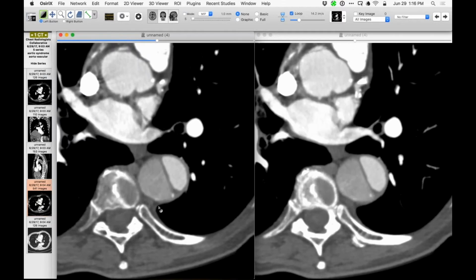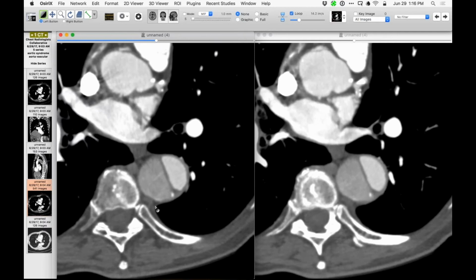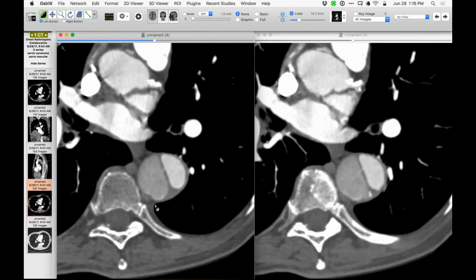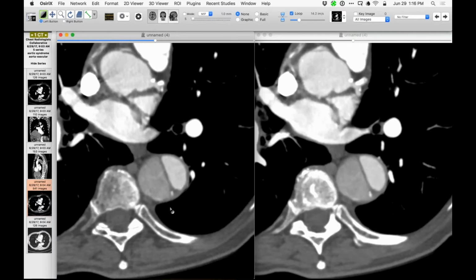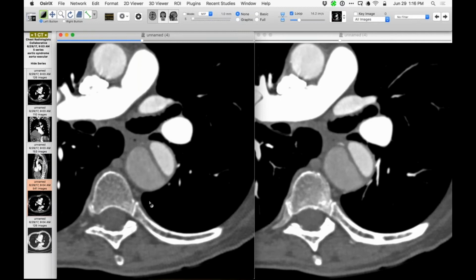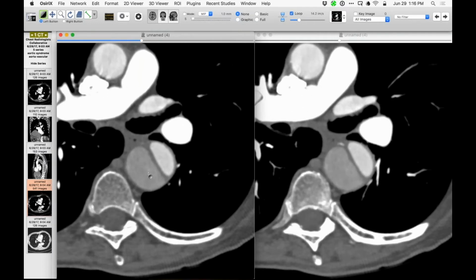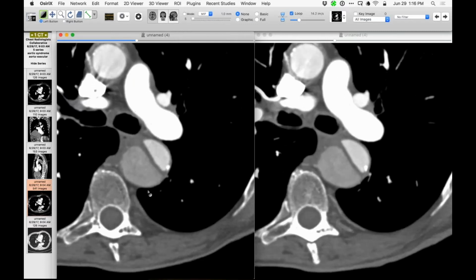Brent, you mean like they're the source of where the little branch artery pseudoaneurysms would have originally been? Yeah, and certainly not in all those cases, but in some of them, could some of them theoretically be due to that? I don't know, because I think that's intercostal, isn't it, there? Yeah, that one looks kind of like, yeah. No, I don't know. I thought they were just tiny intramedial disruptions, fenestrations. I'm not sure. It's interesting.